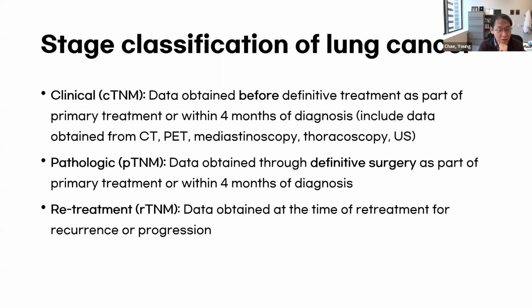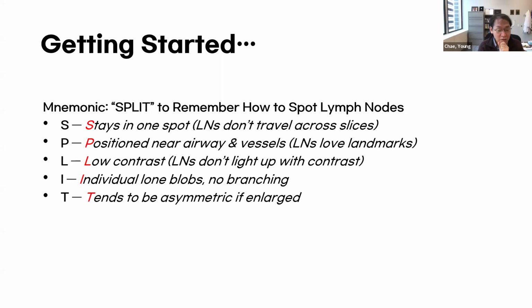And so this L, I have a question. Don't light up with contrast. Isn't there a little bit of enhancement? Yeah, it lights up a little bit, but it doesn't go really white, you know? Okay.